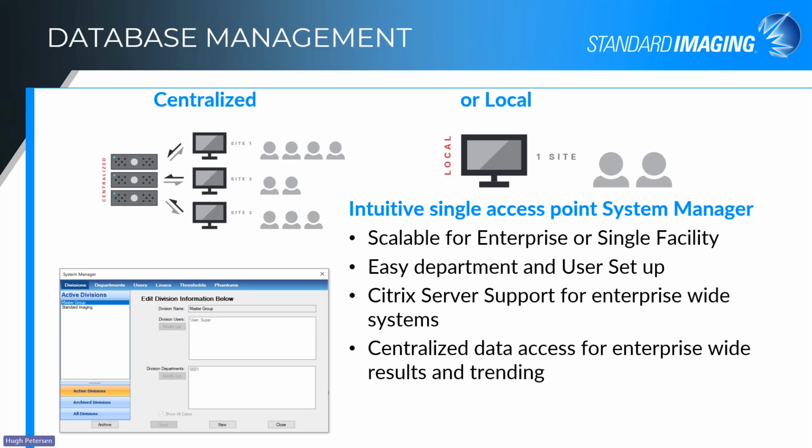Again, that centralized database, so the administrators can see what's going on at not only the single site, but if you want to have access to other sites, just so you can compare and see how other sites are doing, or track everything, you can do that as well.